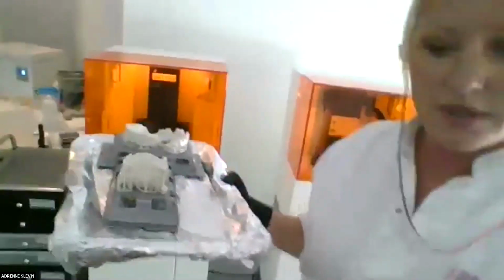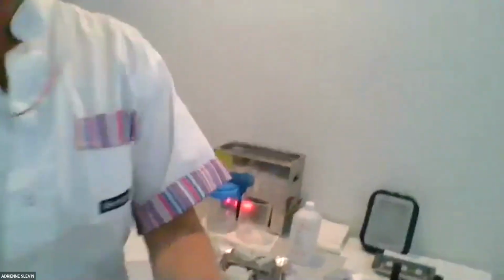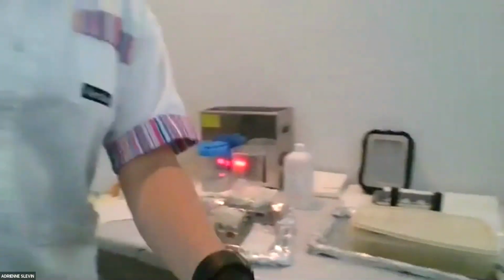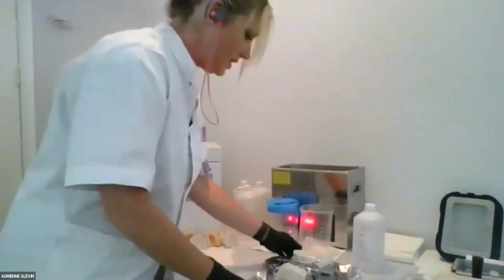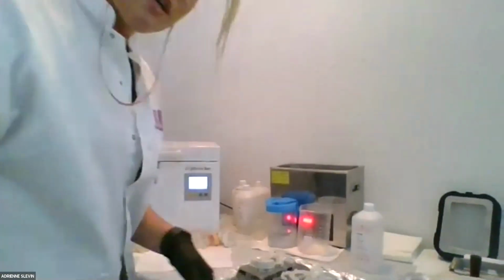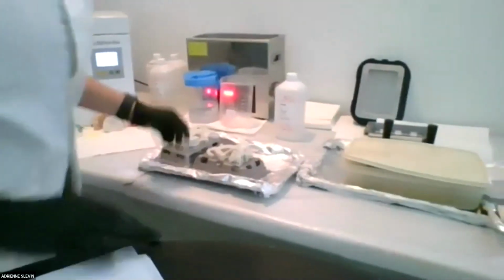I'll show you how. But I'm going to carry you guys over to the cleaning station and just show you my setup real quick. We're not going to go through the whole process, but I want you to see what it's like to remove builds from that build plate. And this thing, if you have some nice, easy, thin supports like we use on ours, you're able to just pull them off.